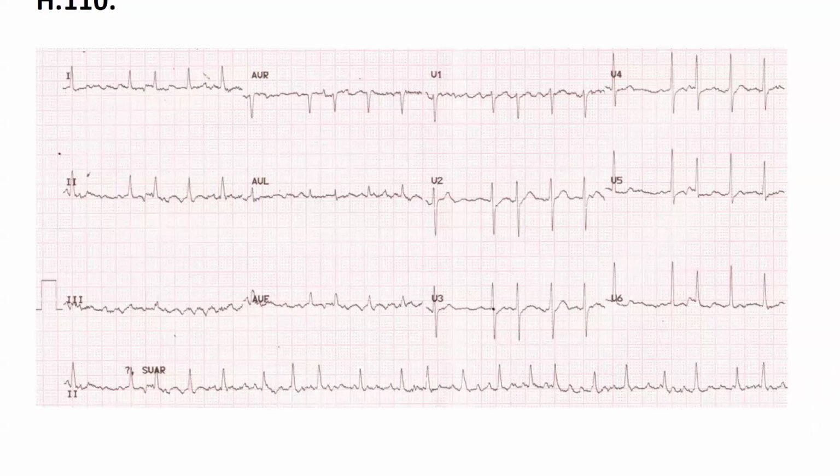Okay, so because it is arrhythmic and there's no P wave, we have atrial fibrillation. Very good. We do have AFib. That's very, very good. So we don't need to talk about the P wave or PR interval.